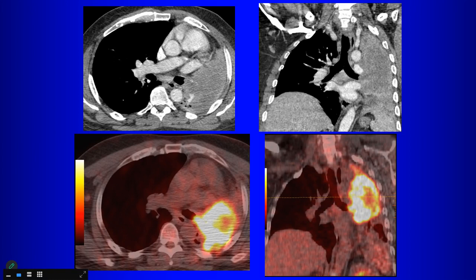Sometimes you do get enhancement, and we've seen enhancement of the lung atelectasis with the PE protocol. But you're much better off doing it as a routine chest CT, where there is more of a delay to give time for the enhancement of all the vessels and the differentiation between the atelectatic lung and the tumor itself. So the PE protocol is not the optimal way to image a lung cancer.